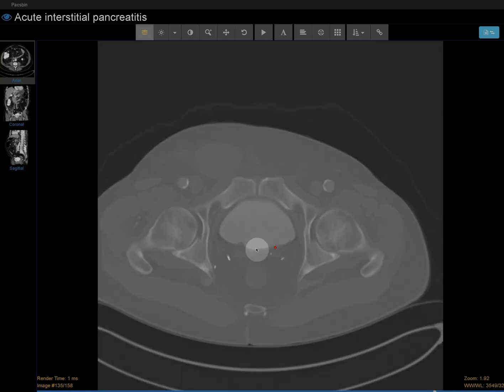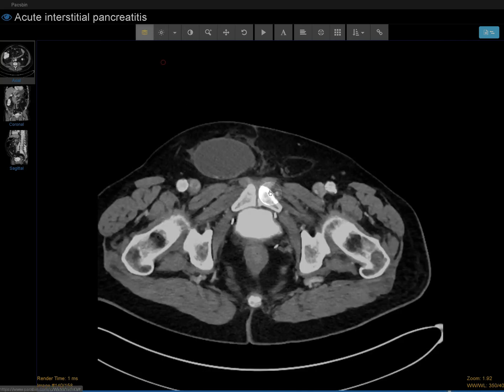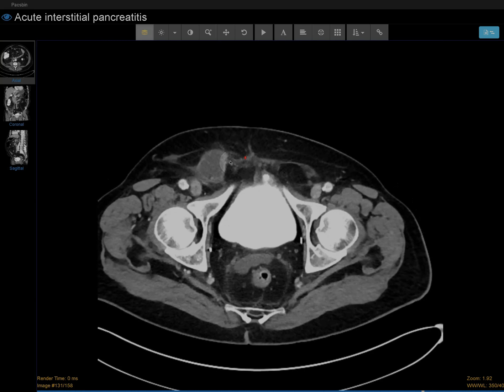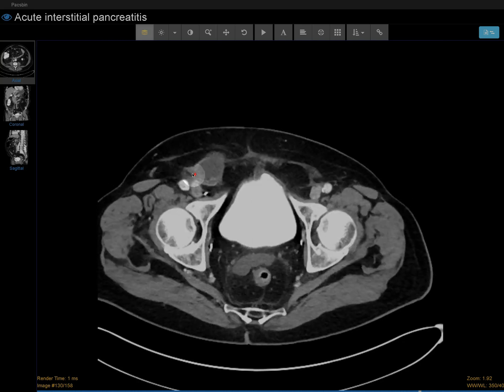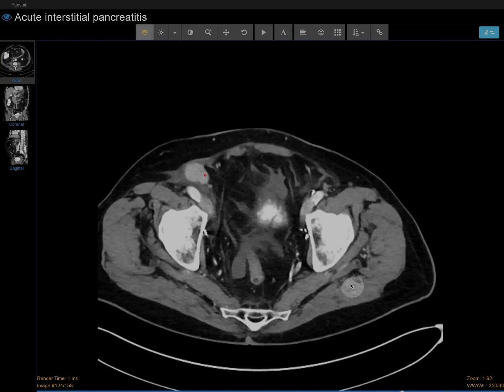And we get a good look at the bladder here. This person had some kind of surgery around; we see surgical clips. And now I follow my search pattern at this point. And okay, something else that caught my eye is that there's fluid in the right inguinal canal, just tracking down. There's no loop of bowel, but just fluid tracking down.